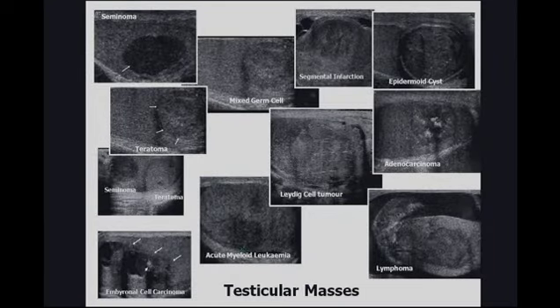On ultrasound, these lesions may take many forms. The classical seminoma is known to all of you as that low reflective, well circumscribed abnormality within the testes. A teratoma, which contains many different cell types, will look very different with areas of calcification and mixed echogenicity.